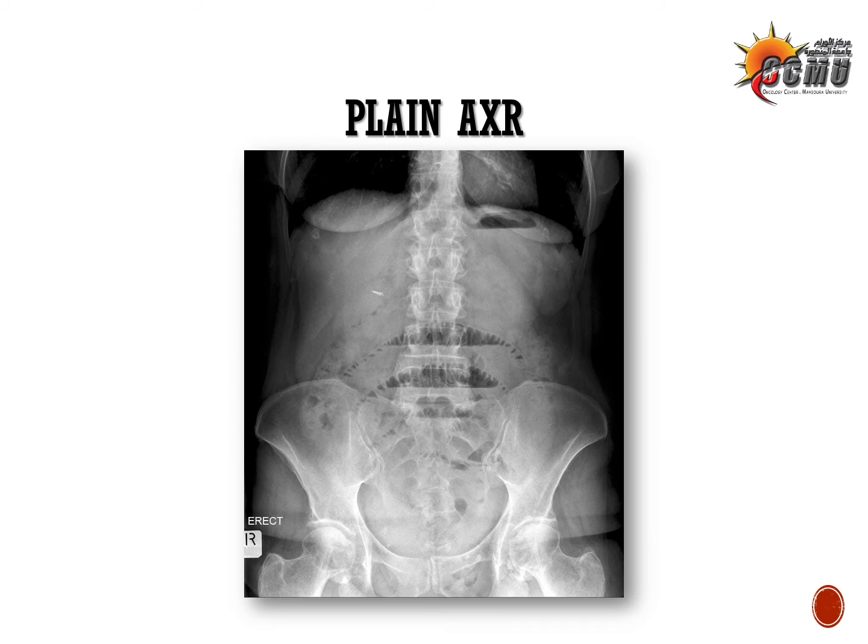Again, this is a film showing the string of pearls sign of air trapped within the small intestine, which is exclusive for small bowel obstruction.